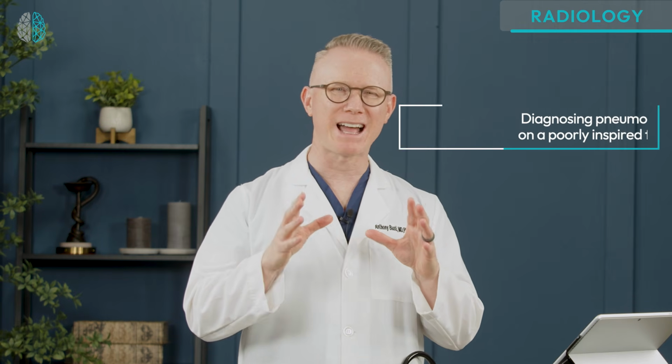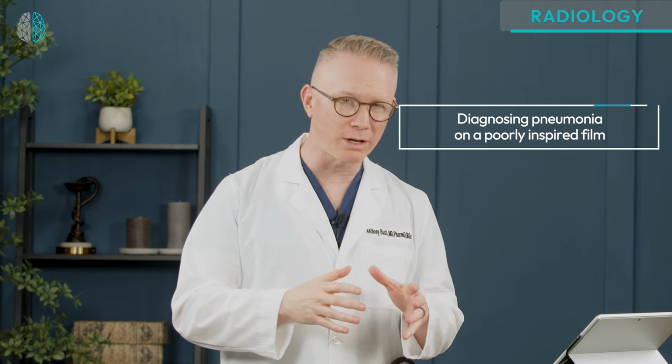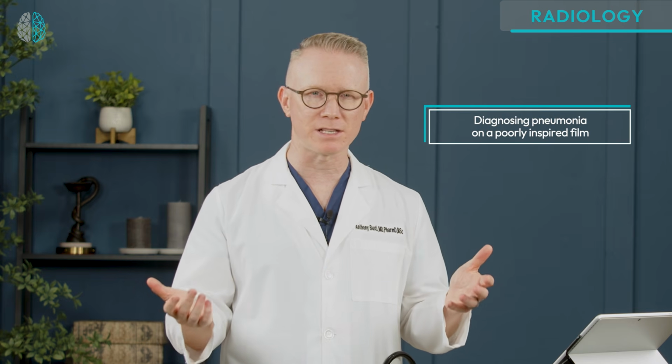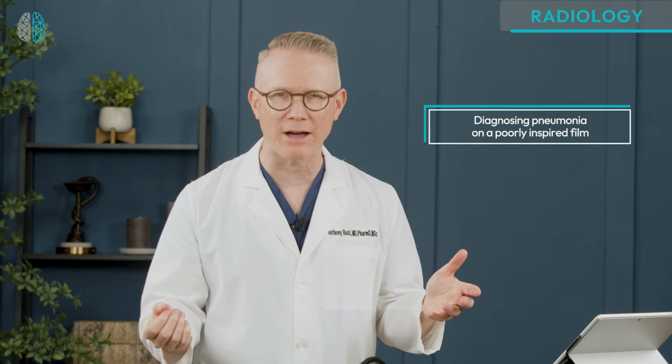Second, diagnosing pneumonia on a poorly inspired film. Underinflated lungs, look at the bases, look a little bit hazy and sometimes crowded, and can mimic things. If the diaphragm is high and you have fewer than 5 ribs anteriorly, think, man, you've got poor inspiration before you call that pneumonia.